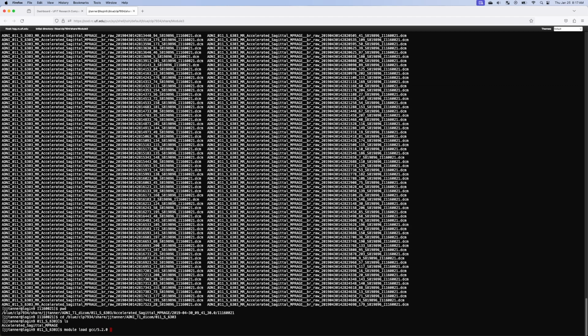I can do another space and load in a software called MRIcroGL, or MRI CRO GL. And this is software that will include that dicom to NIfTI. And then we're going to load one more software called pigz, P-I-G-Z. And to load pigz, we need to load this GCC application or software.